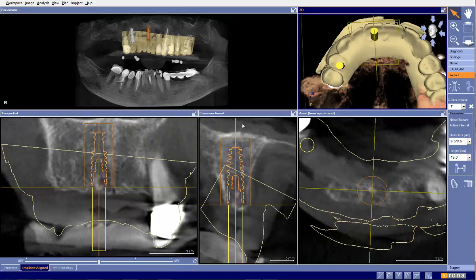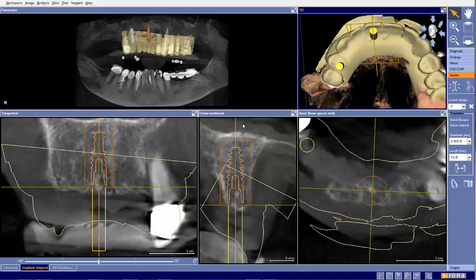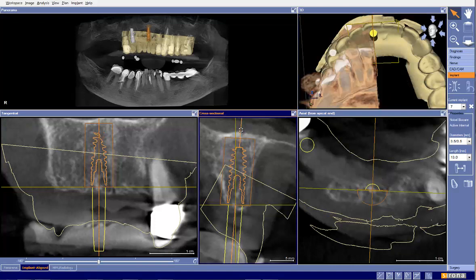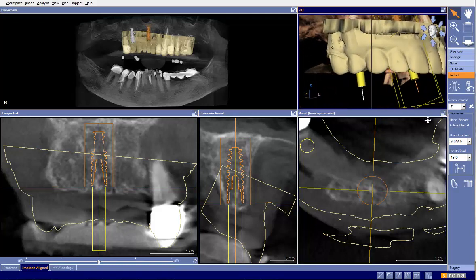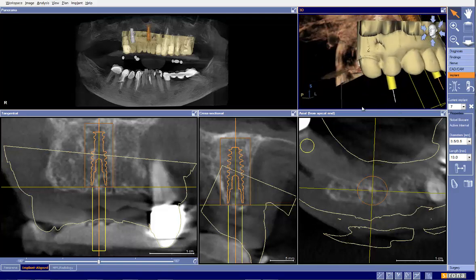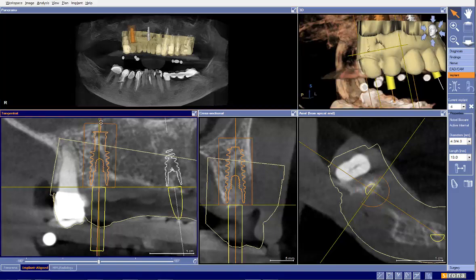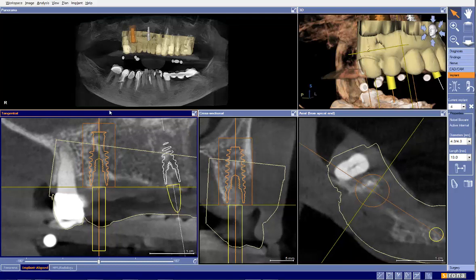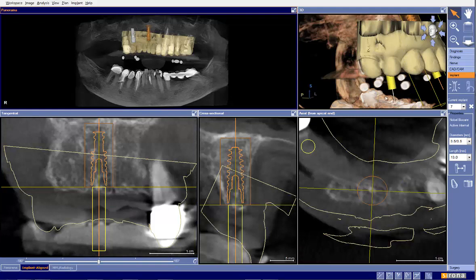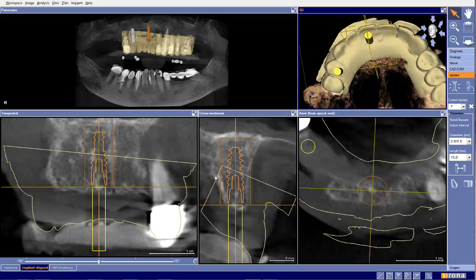We have the ability here. Again, I'm concerned about my divergence. If you take a closer look here at that angulation, that's a pretty decent angle right there. So what I would like to do is tilt this back, and now we're looking a little bit better, and I think that will actually work pretty nicely. If we also take a look back here at number 5 from this angle, you can see it's still tilted to the mesial a little bit. So we may want to consider just tilting that a little bit more. I think that'll work quite nicely. And there we go here.